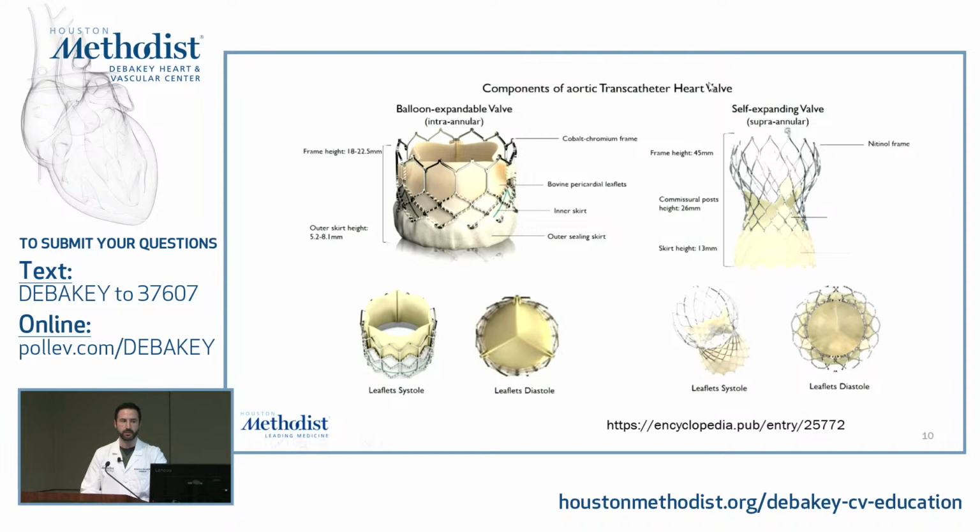So your balloon expandable valve here, you can see you have your metallic frame, and then you have a skirt that surrounds the frame. Same thing for your supra-annular self-expanding valve. You can see the metallic frame here with the skirt. And you can see the leaflets here, how they open in systole and close in diastole, as you would expect them to. So same thing here, systole and diastole.